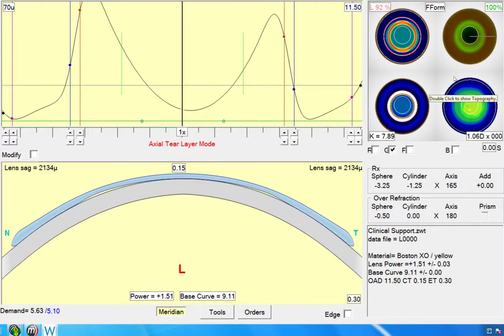And then on the post-treatment topography, we could see that the reverse curve zone was kind of incomplete. This is the left eye superotemporal. And so that could be either that there is not enough sag at the lens here in this area, or it could also be that there's too much sag in the lens peripherally, and it's preventing the back edge of the reverse curve from landing on the cornea.